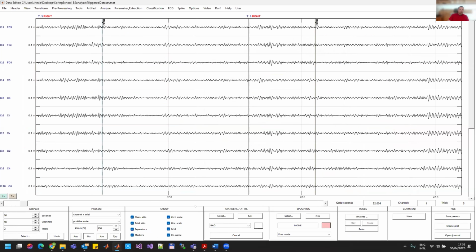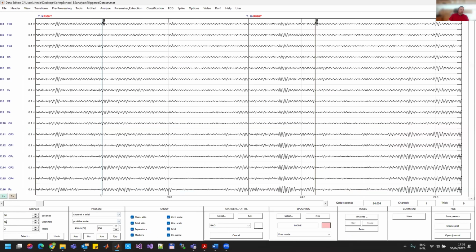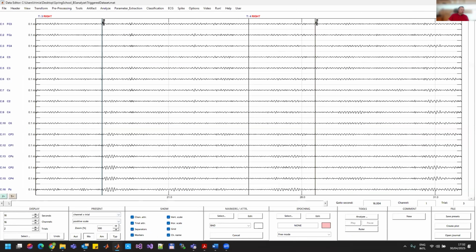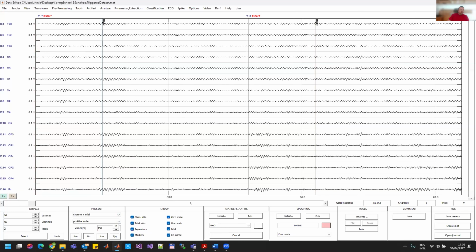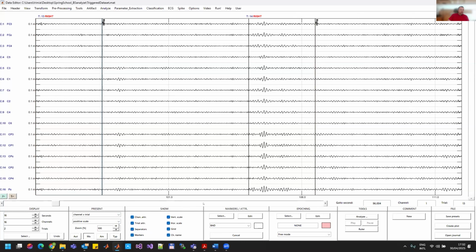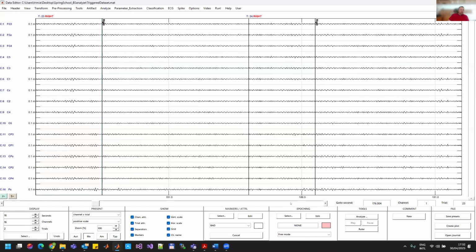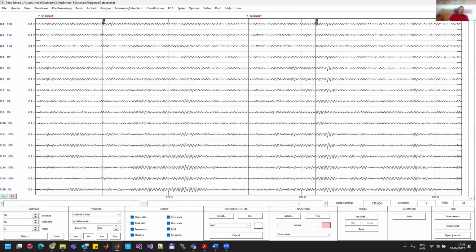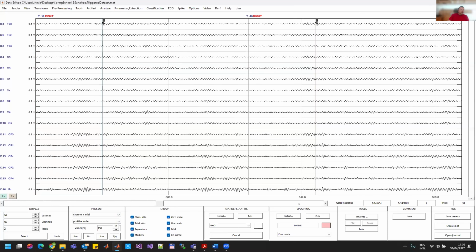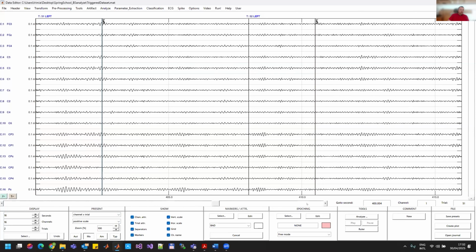So the right trials, that will add also the full number of channels. We'll try to be very fast on here. Of course, it can be done also automatically. I will do it manually because there aren't so many. And if I do see a spike, a trial with a spike, I will just kick it out. But I'm doing this so you can see how to mark a trial as an artifact and eliminate it. Up to now, none.